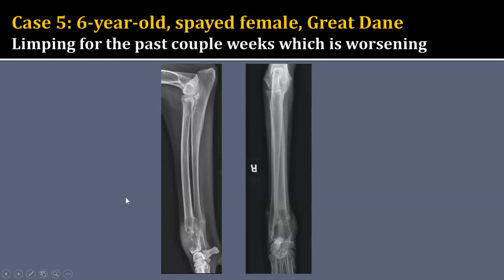When I next look at soft tissues, I see focal soft tissue swelling that is at the cranial aspect of the distal radius. It also looks like it goes a little bit medially. I don't see any other soft tissue changes, so this is focal extracapsular, almost mass-like soft tissue swelling. When I look at the bone starting proximally and moving distally, really the only abnormality I see is in this distal radius, and centered at the metaphysis with involvement of the distal diaphysis and the epiphysis is a region of very severe moth-eaten lysis with very severe involved cortical lysis as well.